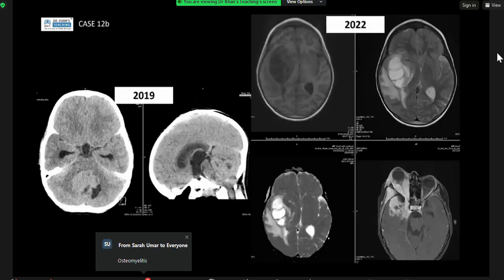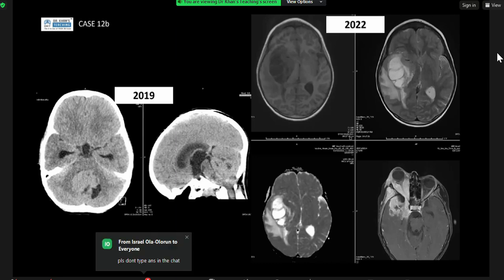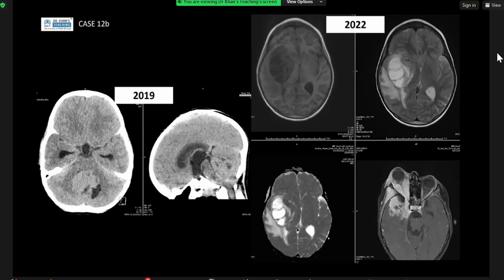But if I told you that this is the patient's brain imaging, would you... I see a fourth ventricular mass and then a solid cystic lesion here, and is it neurofibromatosis? No. Some form of the orbit is involved. I see a lesion of the orbit cavernous sinus. I see a lesion in the intraparenchymal basal ganglia too, and medulloblastoma, and NF, tuberous sclerosis.